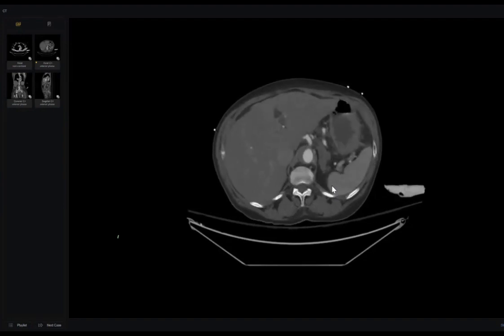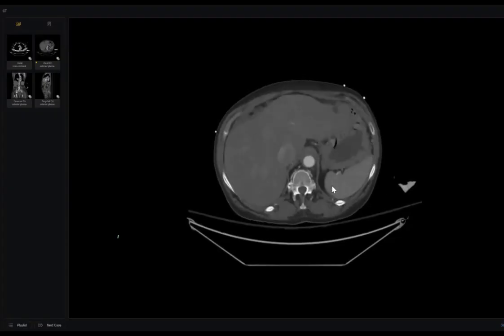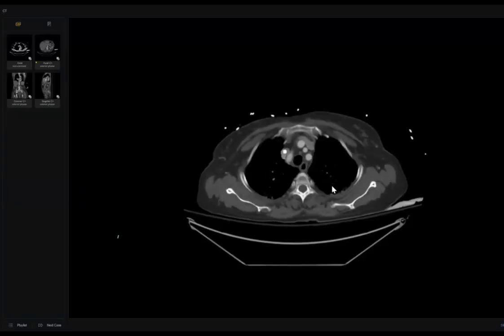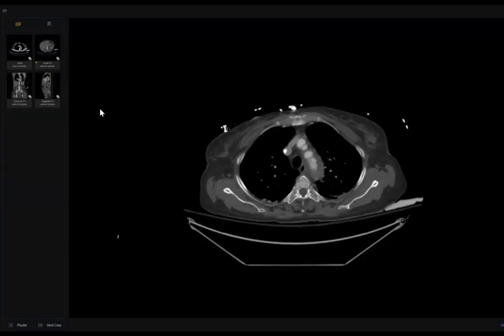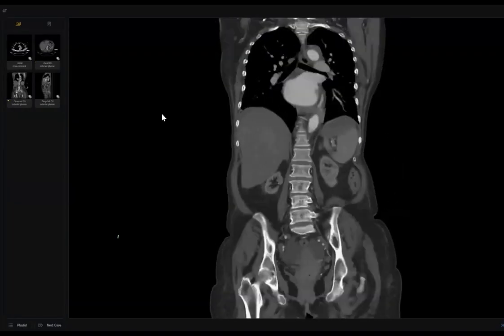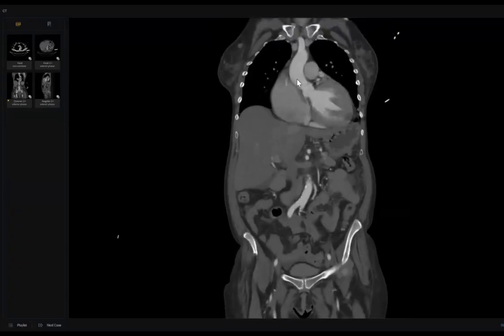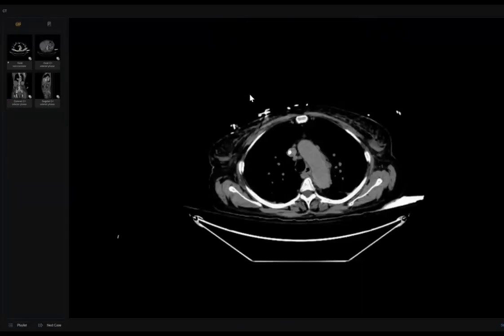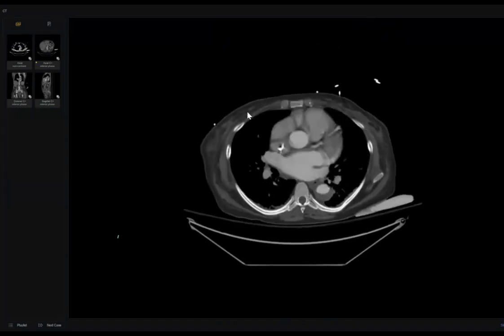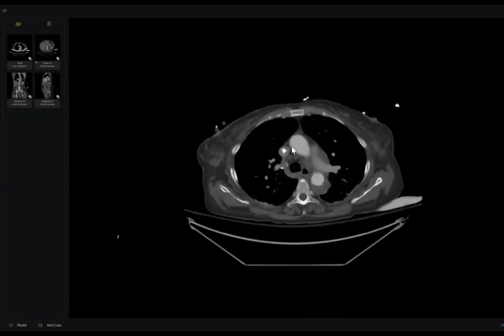Intramural hematoma. Especially try to pick up any extension in other arteries, in the mesenteric vessels, in the major vessels superiorly. Unfortunately, you will not find it. Second point, this is not type A, my doctor. Why? Look here, very normal ascending aorta, very normal diameter. Compare the diameters here, at least if you are confused. Look, completely normal.